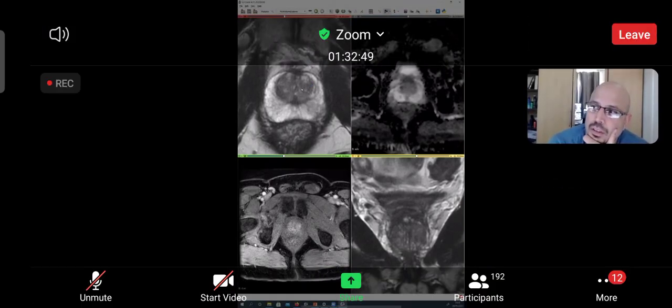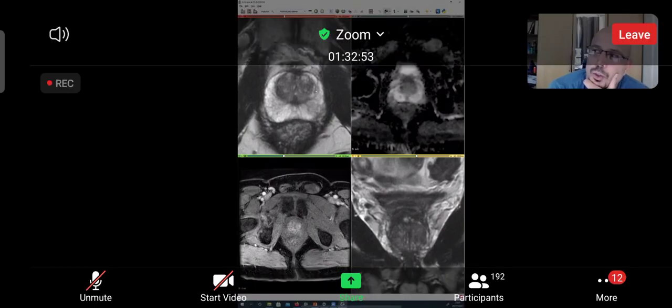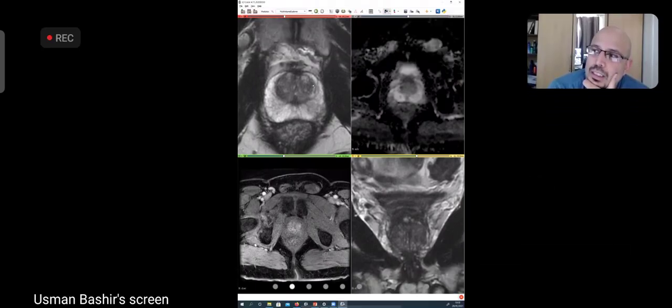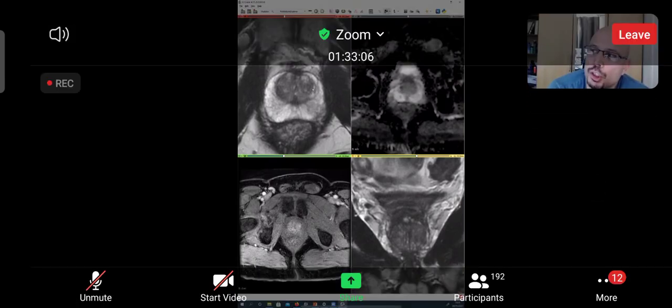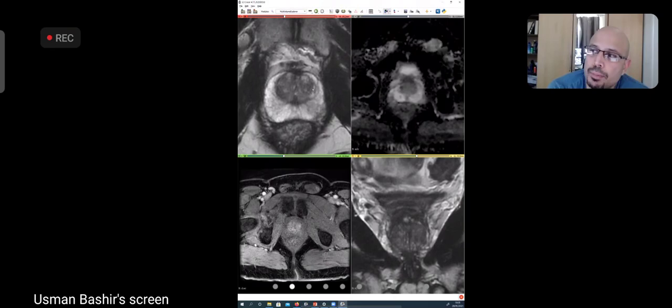Cancer, the bubbles are gone in that area. It's going to be asymmetrical, because some people's tissue looks so packed and diffuse. That would be cancer.